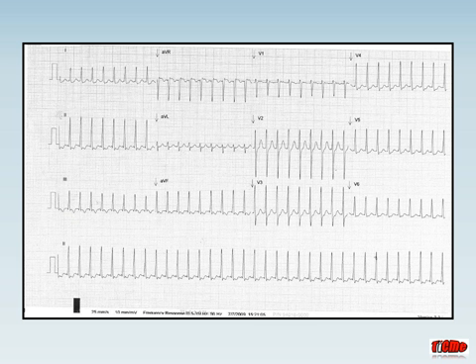Now, this rhythm is actually called AVNRT, or AV nodal reentrant tachycardia. If you trust me for a minute, and I'll tell you that this small R prime wave and this small S wave are actually P waves, then you can see that the RP distance is short. So this is a short RP tachycardia. Let's learn about AVNRT in a little bit more detail.